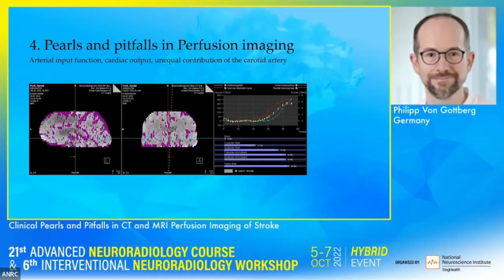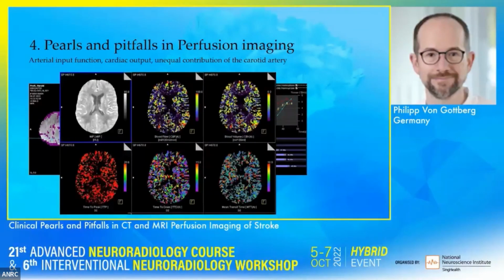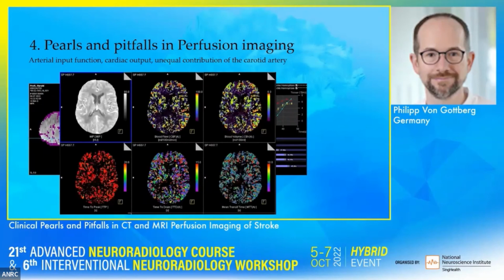However, in CT perfusion, the crucial parts of the examination are the beginning of the arterial increase and the reaching of the peak. And then if you still get some data on the venous outflow, actually from this part only of the whole examination, you can already create readable images. And in this case, if we just adapt our images to this cardiac output insufficiency, I will show you how this image performed in reading. So this is not very well, actually. We don't see any valuable information on that.